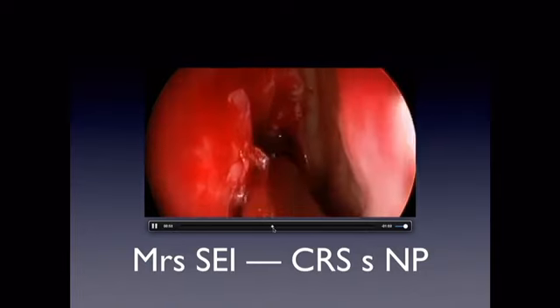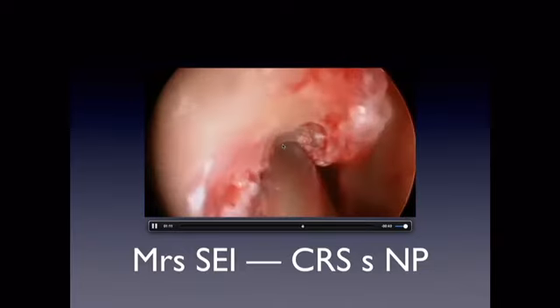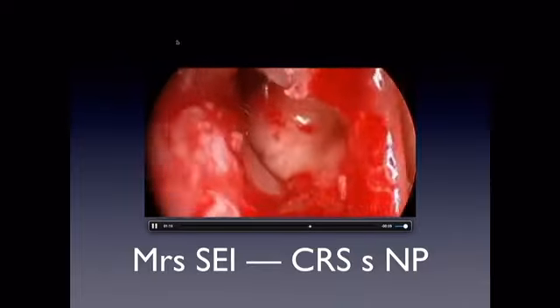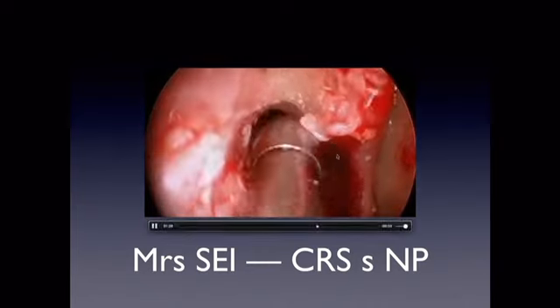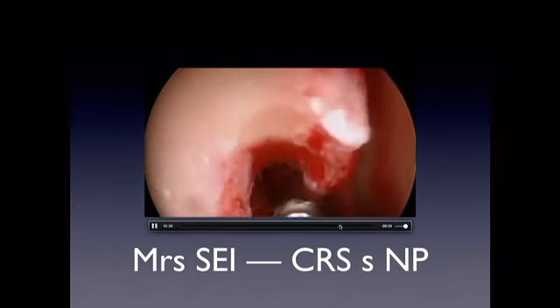So I'll just save you a bit of my drilling here, because we had some problems with the imaging before. But as you can see, as we're progressively broadening that, that's actually that frontal beak that we're seeing just up here, projecting posteriorly. A little bit more expansion of that frontal beak, and a bit more space there.